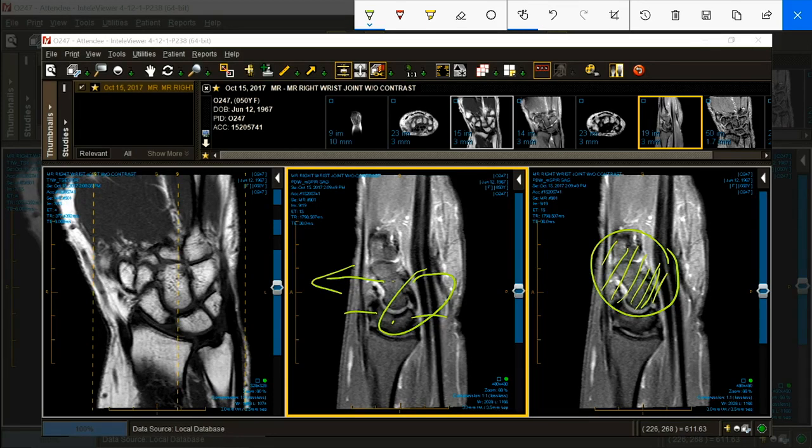So you're going to call that tendinitis or tendinopathy every time, unless you see a hole, a gap, a transection. Peritendinitis, interstitial edema: do not call that a tear, because somebody will get an operation. How do I know? It's the last case I defended a radiologist in court on.